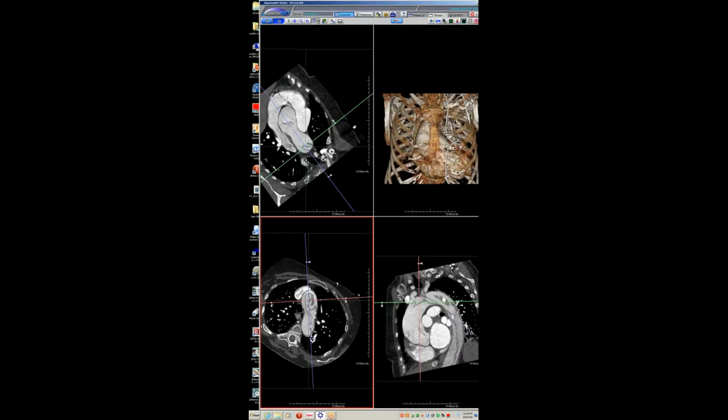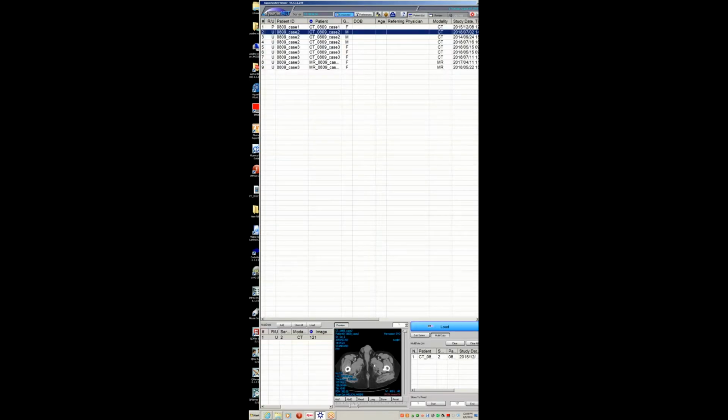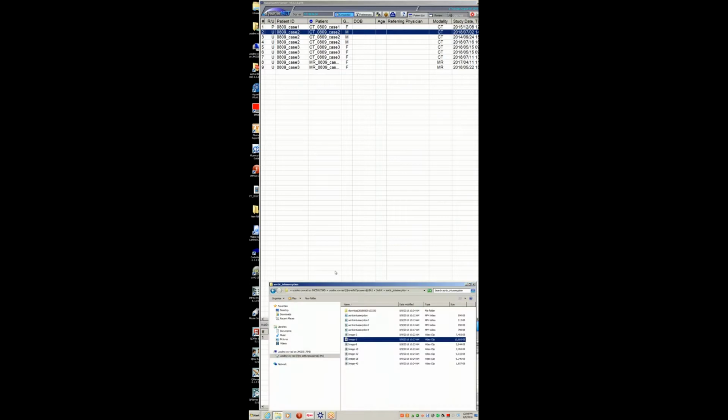This area here where you don't see a flap, that's where the... for a couple centimeters. Yeah, I just didn't know it had a name. There we go. Let me pull over another study real quick. This is something I've not seen either.